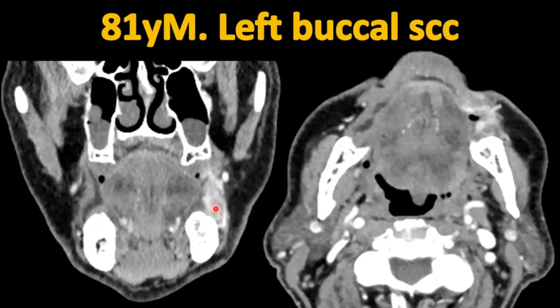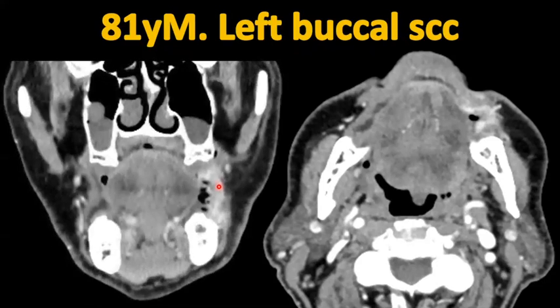And honestly, for oral cavity imaging, you really want to have coronal reformatted images or coronal plane MR images to help you with your imaging. But you can see this lesion. Now, while it is arising from the buccal mucosa, it's going to extend laterally. It will also extend down, in this case, down to the insertion of the buccinator muscle onto the mandible. And it can also extend upwards, although it does not in this case, and this was a buccal tumor which was completely excised, because surgical excision is the mainstay of all oral cavity tumors.